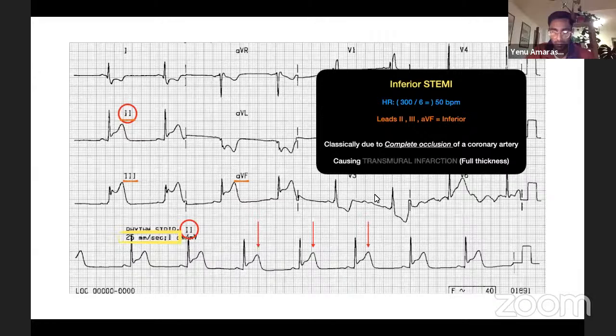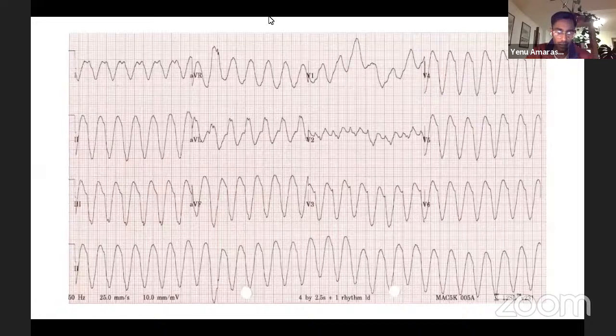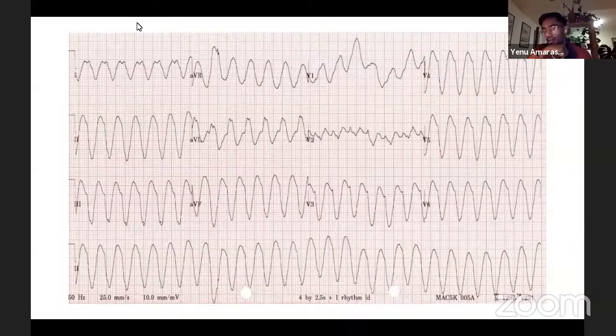Yeah, so this is the other ECG. I'll leave it up for a bit, and then I will go through the ECG like I did with the previous ones. I see some people writing answers in the chat. If you guys want to be more specific, there's nothing I can give you for a bonus point, but if there's anything else you can add to whatever answer you come up with.